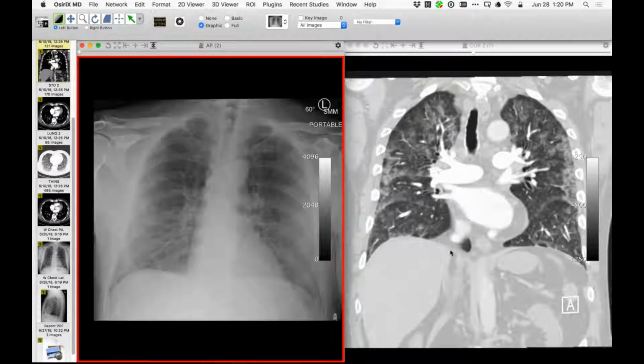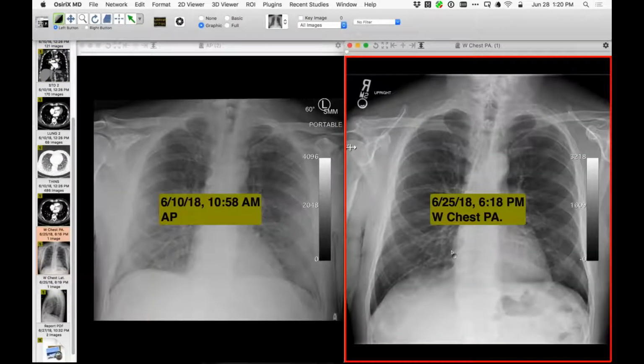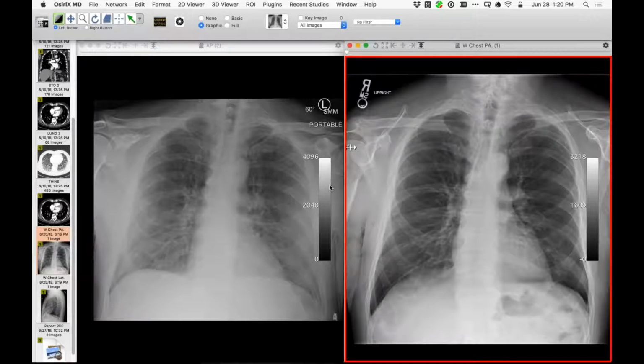So this patient did pretty well. They took the drug off, gave him steroids. Here is a follow-up. His chest radiograph looks very nice now, all healed up, and presumably they won't try the naltrexone again. So a nice case of that. It seems like in the last couple of months, quite a few of us have shown eosinophilic pneumonia, some of which related to drugs, I think. Yes. And then others idiopathic, yeah.